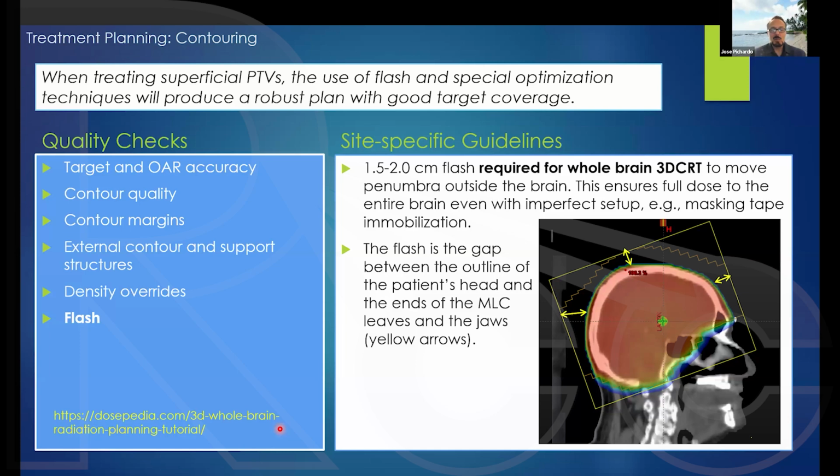Yeah, you want to get full dose on the brain. That's the objective. You don't want to get 90%. You want to get 100%. You know what I'm saying? So basically you're extending your 100% outside of the patient's head on purpose, so that you can't give 90%, right?